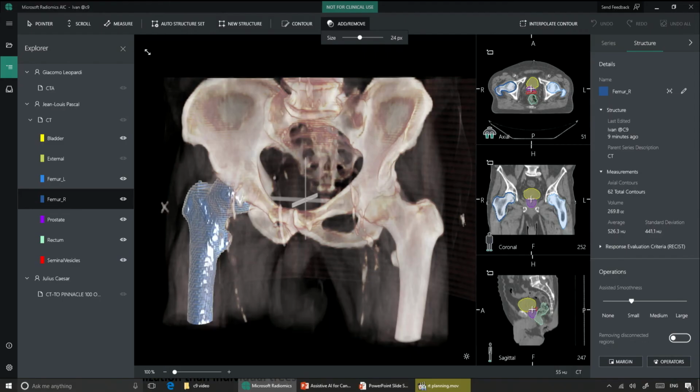Yeah. So this program, we wanted to build this program. We didn't want to build an abstract, researchy tool that only does one thing well, which is not practical at all, right? We wanted to build something practical, and we built in a lot of more conventional tools that people would use. And I can show you a quick demo here.